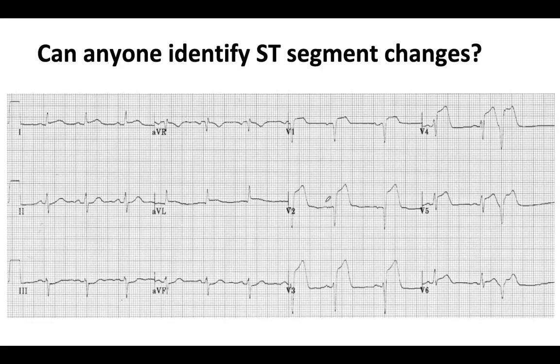And then also just here for anyone wondering, this is a PVC, so an early ventricular contraction. And it's happened so that it's actually going on to the next R and T wave. So there's R on T phenomenon happening here.